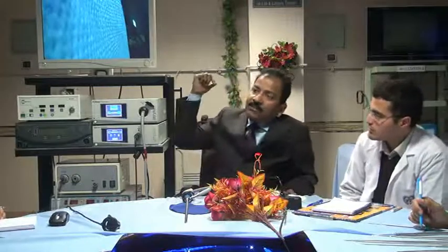Now I will give you two answers to that. Now if you will buy, you should always buy HD and always buy 3-chip, because this is going to stop HD now. If you go to any of the TV showrooms and ask them to give you a glass cathode ray TV, they don't have it. Old, they will tell you, okay, I have to see in the back stock, maybe if one is there, I will give you.